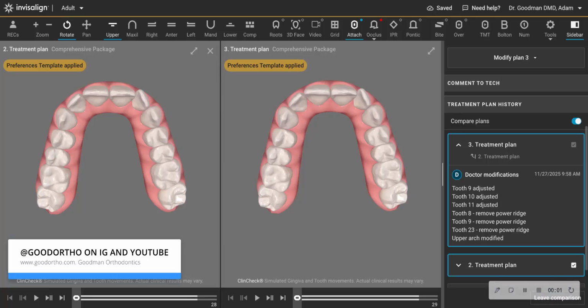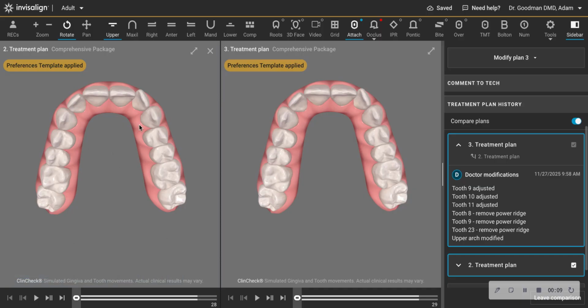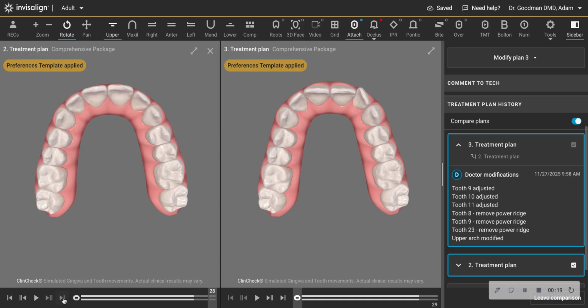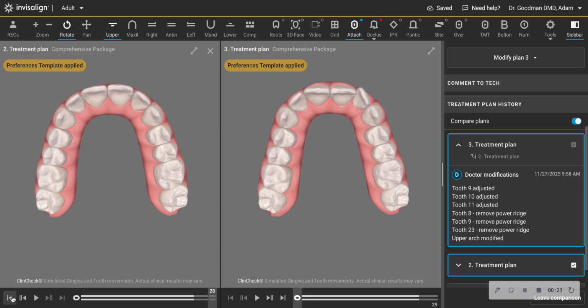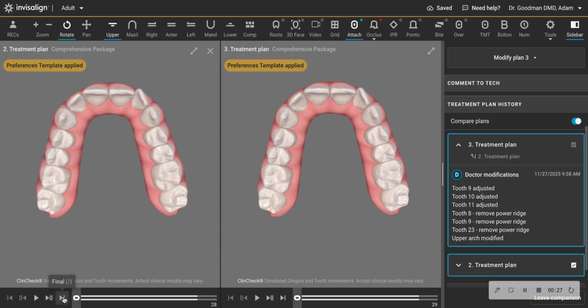So, I always like to share ideas with other orthodontists and Invisalign providers on how to make your cases more predictable with Invisalign, how to make your ClinCheck programming more predictable, and also minimize attachments. Now, here you have a patient who has a rotated number 10, and on the left of the screen, focus here. This was the original ClinCheck, and you see most things look fine here, expansion laterally and forward, making room to rotate the mesial of that tooth in.